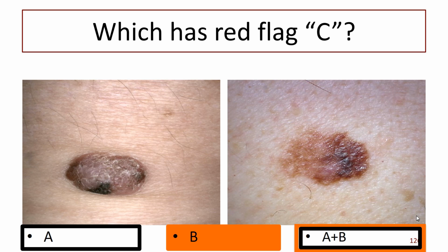What do you think each of these lesions is? Melanoma? Yeah, what about this one? Suspicious. So suspicious of melanoma. What else could it be? Too thick for a melanoma? Or it could be a collision of two things? What two things? So you're thinking seborrheic keratosis, it is certainly very dry on the surface.